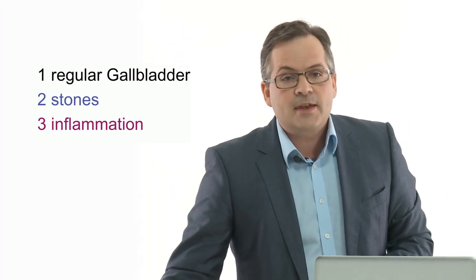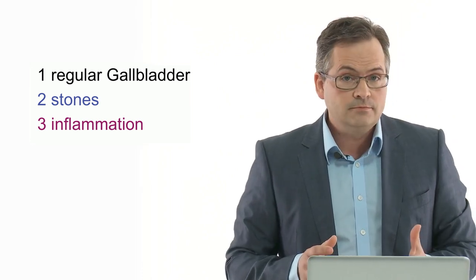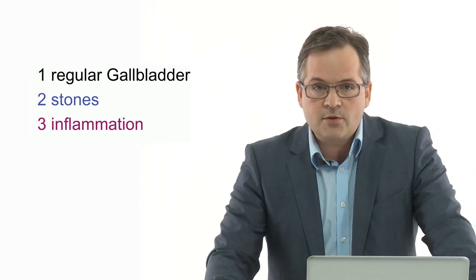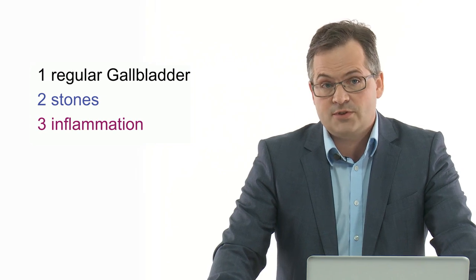In this chapter and the following one, we will discuss the sonographic depiction of the gallbladder and what a normal finding looks like. But we will also describe how gallstones can be recognized, and what the signs of an inflammation and of tumors are.